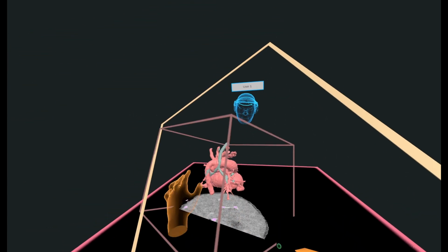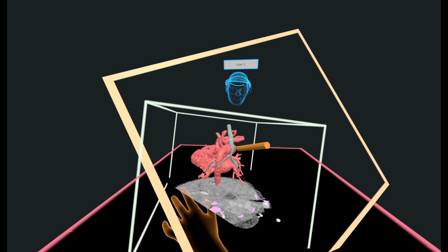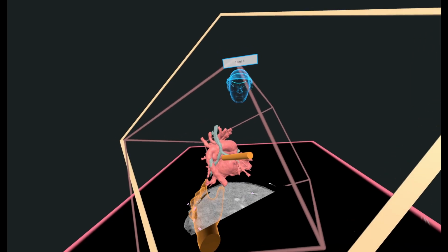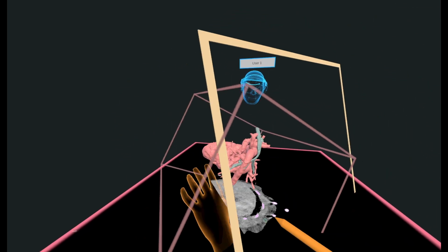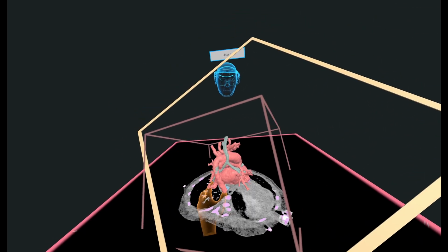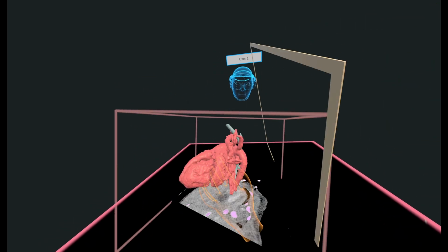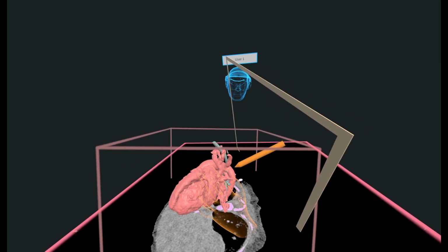So that's part of why that airway seems compressed. It's the aorta compressing. And then that ductal tissue also is compressing some of that airway, which is interesting to see. We didn't think that was going to cause an issue after PDA stenting, and clinically it showed that it was fine as it's straightened this way.